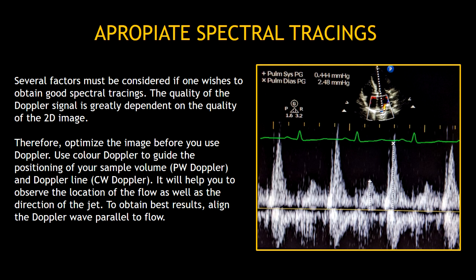Now let's talk about appropriate spectral tracings. Several factors must be considered if one wishes to obtain good spectral tracings. The quality of the Doppler signal is greatly dependent on the quality of the 2D image. Always optimize the 2D image before you use Doppler.